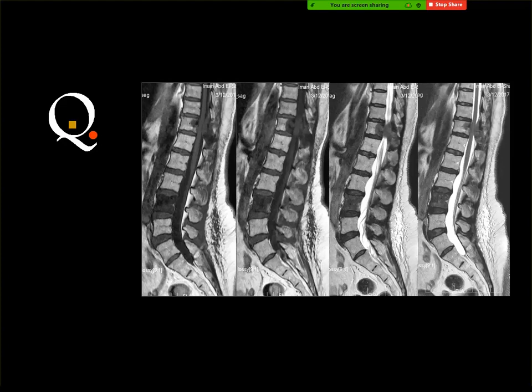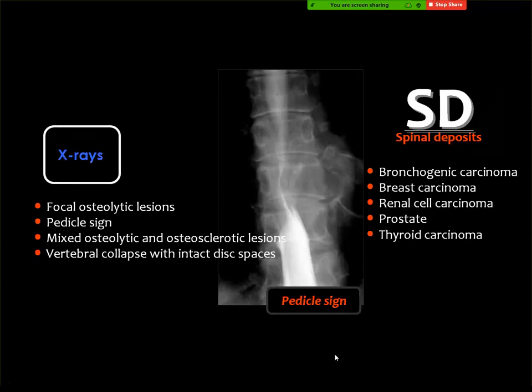Multiple secondaries. Yes, and this is a simple diagnosis, of course. You remember, for the diagnosis of metastasis, you do not usually need to inject contrast material, because you can see the lesions very well in the T1 weighted image. And if there is an extraosseous soft tissue component, whether in the paravertebral space or inside the spinal canal, you can see it very easily.